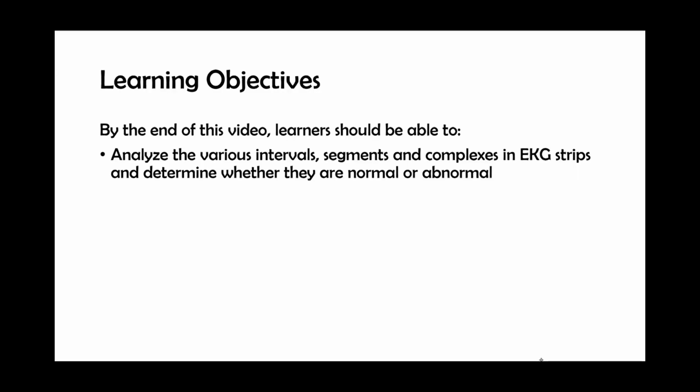Learning objectives for this module: we're going to be able to analyze the various intervals, segments, and complexes, mostly just the important ones, in the EKG strip, and determine whether they are normal or abnormal.